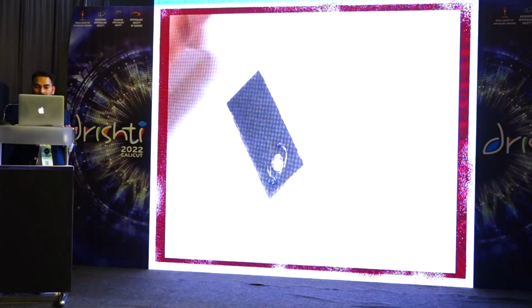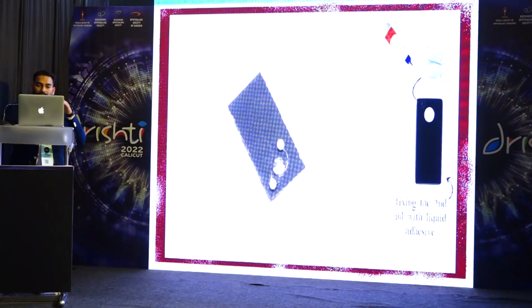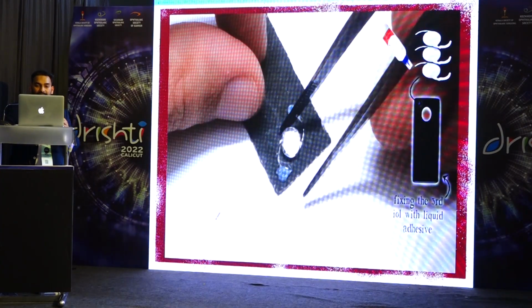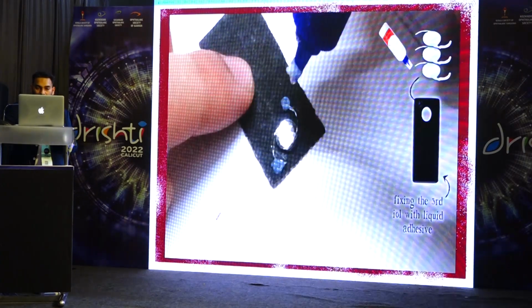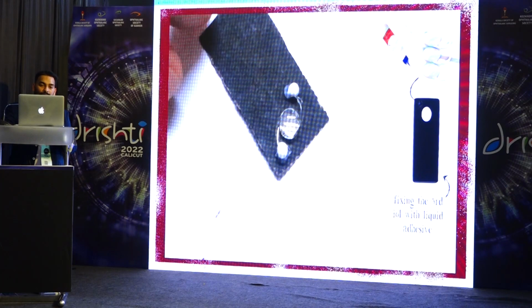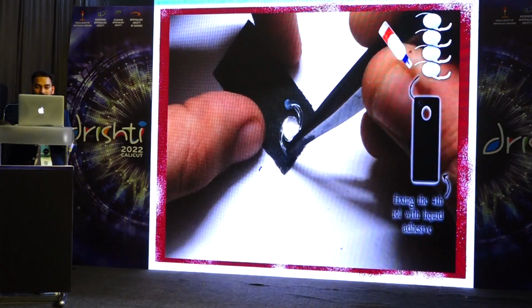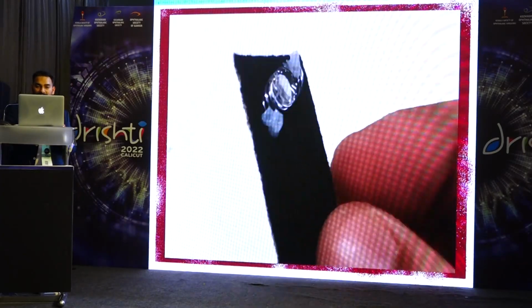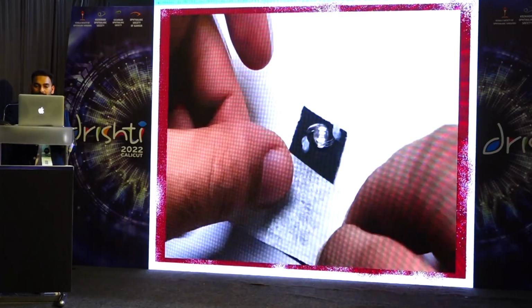You need 4 30 diopter lenses kept one upon the other. You need to be sure that they are properly placed on each other. Once you do this, you're increasing the diopter of the lens, and once it's ready, you can put it on the phone.